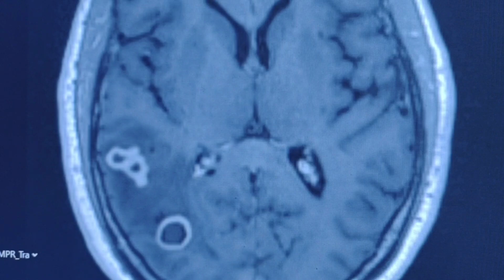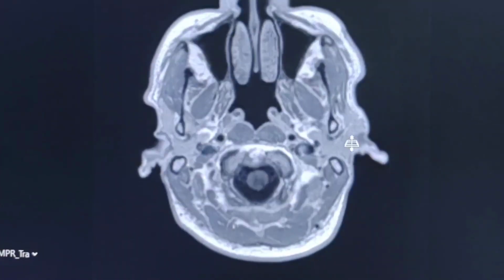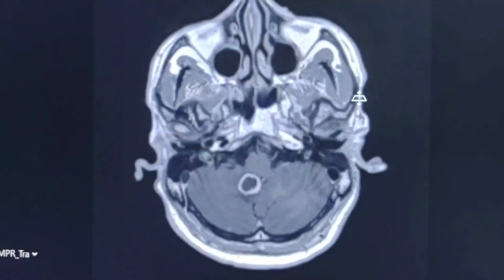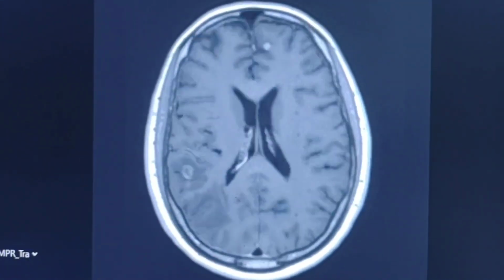And commonly, cerebral disease due to Mycobacterium tuberculosis appears as tuberculomas and rarely as a brain abscess. Once again, I will scroll the images up to have a look at these rare, unusual lesions.